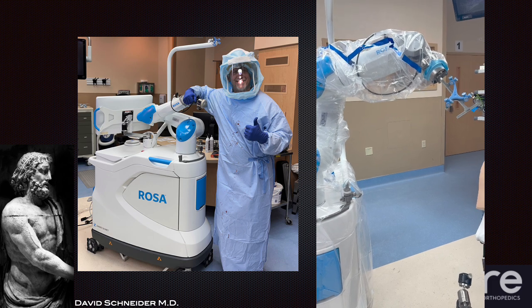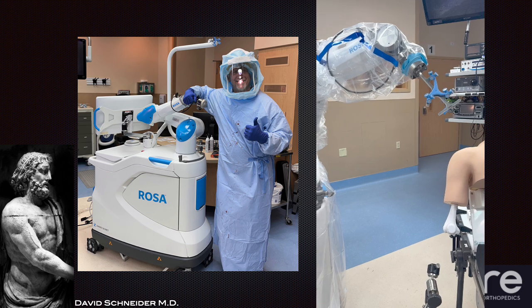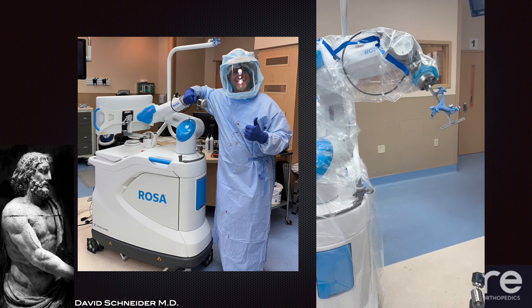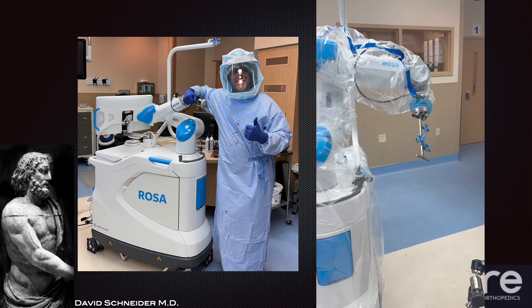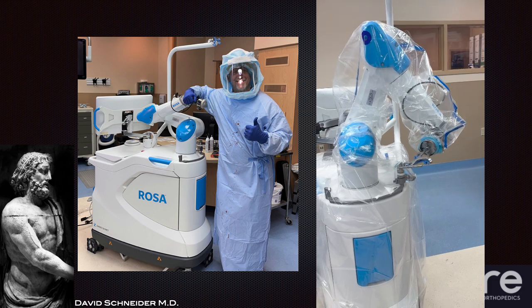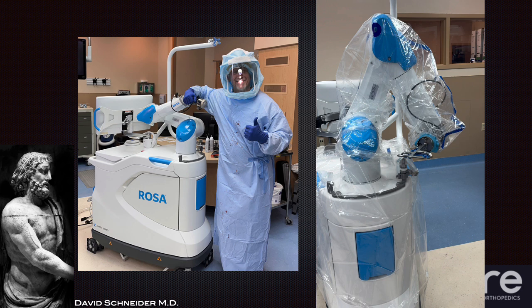We've done all the computer templating, but this allows us, we're just doing what's called the registration with that fake shoulder that's there. But once we're at the time of surgery, we'll have a surgical guide on there, which will then guide us into knowing exactly where we want to put it. And this is kind of the miracle of robotics. We can use the computer templating software to know exactly where we want to be. Then we can use the robotics to guide us, and we're down to the 1 millimeter or 1 degree level of precision when we're doing total shoulders.